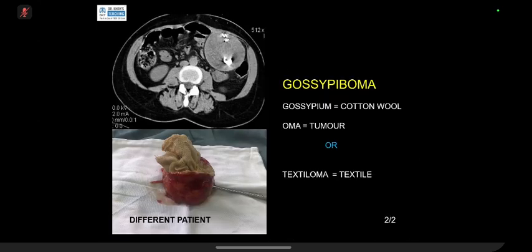In Basildon, we scanned a case of an artery forceps inside. Can you imagine? Luckily, this was overseas. The surgery was done overseas, but we have seen an artery forceps. And I've got 3 cases of gossypibomas in my teaching files. One of them on MR. Luckily, all the surgeries were overseas.